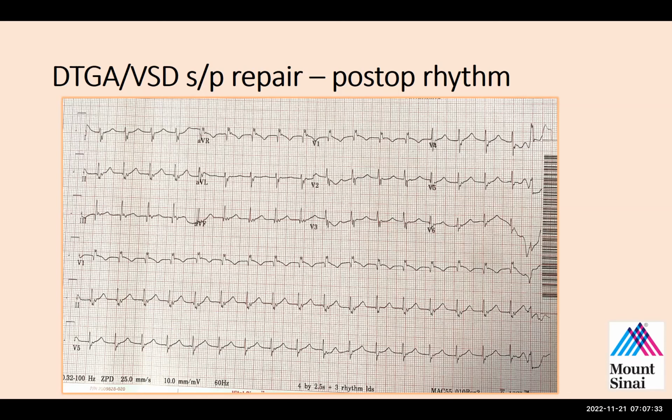So it's around 107 or 110. So yep. So not accelerated. Can you tell me if there's any relationship between the QRSs and the P waves? I agree with you. This is junctional rhythm. There's no P wave preceding every QRS.